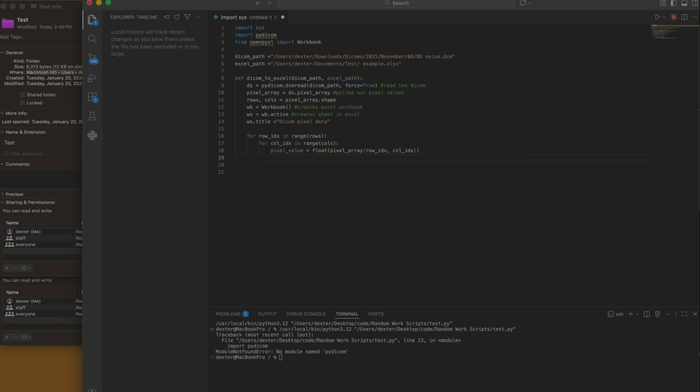And now we've taken them. Now we want to paste them in the cells. So this is a weird computer sciencey thing. Python counts from 0, so it counts 0, 1, 2, 3. Excel counts 1, 2, 3, 4. So we have to take where our rows and columns are and just increment it by 1. So we take the cells in the worksheet.